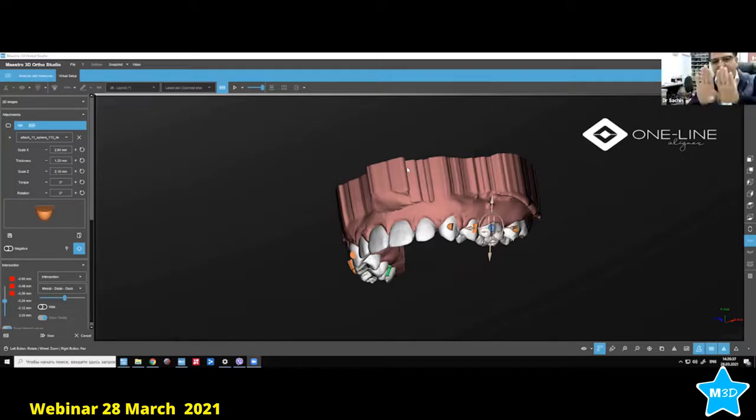So it's going to be like a spring. We make a torque movement and a positive movement with negative attachments on the palatal incisal side and on premolars. The aligner will fit in the mouth, and the power ridges on the premolar and on the central will act like a spring and move the teeth forward. So yes, we do use negative attachments.